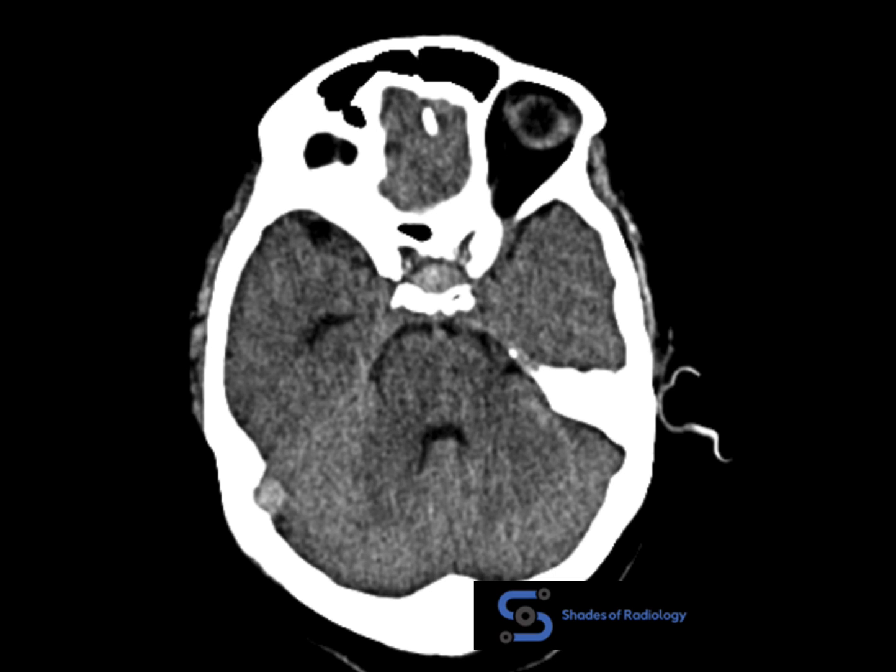Another classic one, young female or middle-aged female with severe headache, vomitings, dehydration might be the risk factor. So always look for the hyperdense sinuses. So this is the hyperdense sigmoid sinus, and even in this patient the transverse sinus was also hyperdense, which is suggestive of venous sinus thrombosis.